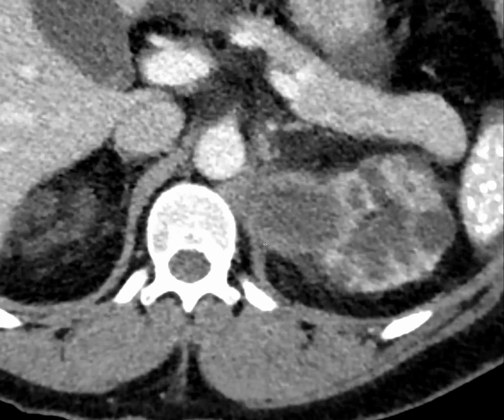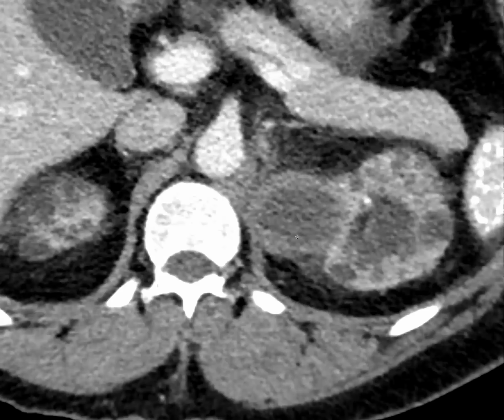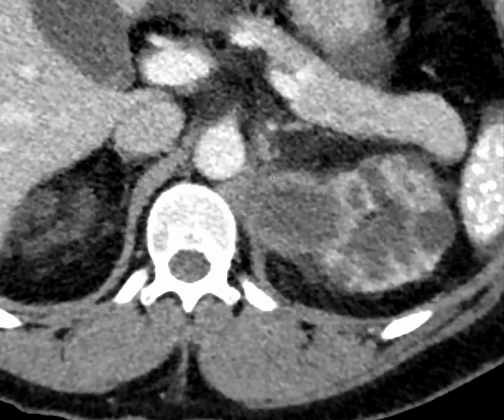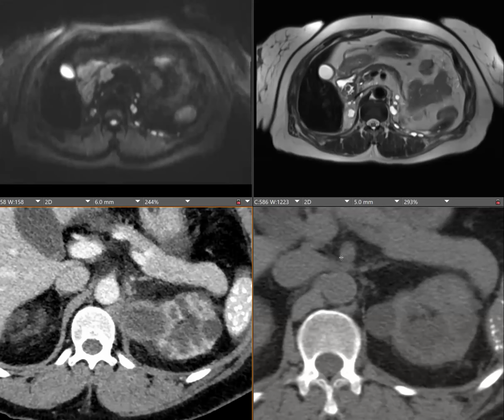Yeah, the wall was enhancing, the thick rind of soft tissue is enhancing, and then these nodules, if you're able to see, I don't know if it's projecting well. There was small nodular soft tissue inside it as well, so that was also enhancing.